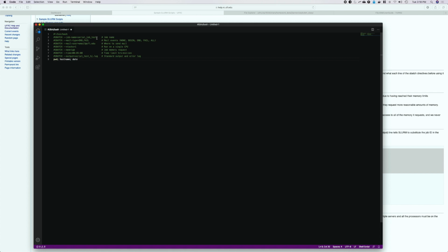And this is where we need to start editing. So now I'm going to call this a VBM randomise, with my initials. Again, this is just a temporary naming convention on HiPerGator. You can call it whatever you want. And then mail type, end and fail. Options are none, begin, end, fail, and all. In this case, I'm going to keep these defaults, end and fail.